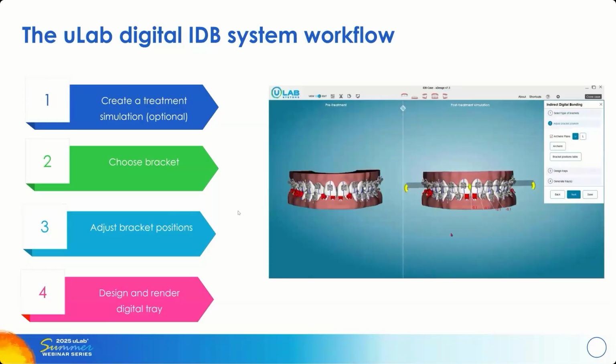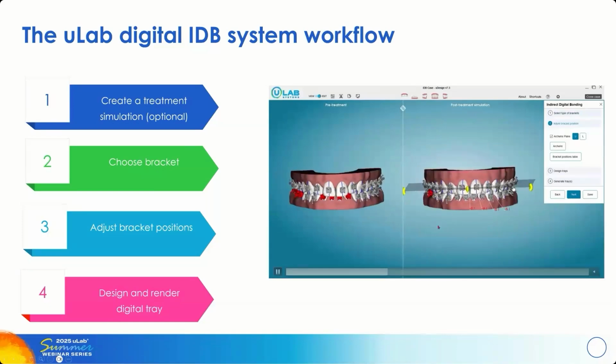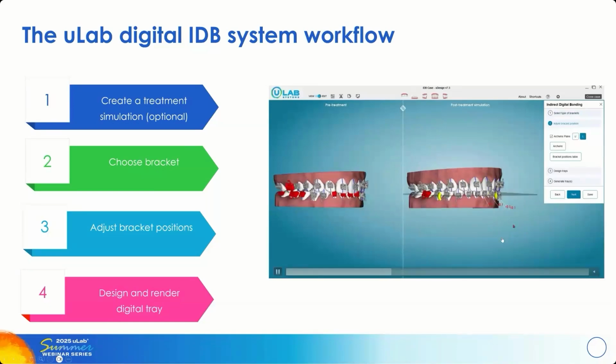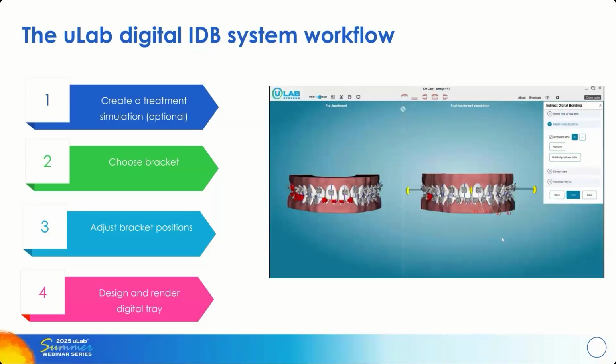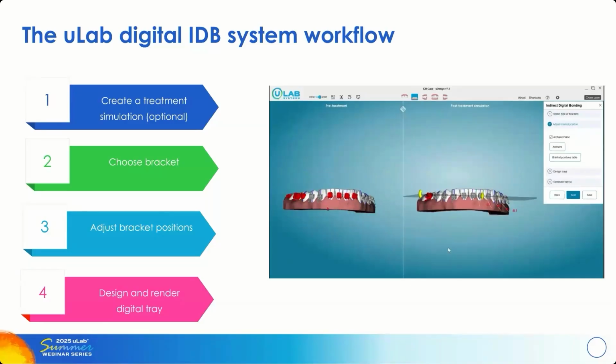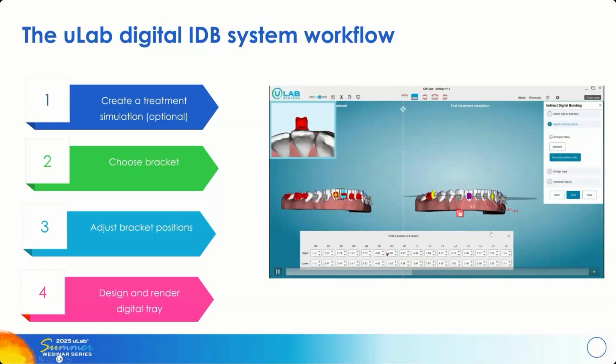So again, this is a big topic, but you can do it today in practice in the uLab system. But you need to know that this is a work in progress, right? And if you have any questions, I'm more than happy to get on a call and talk to you about this. But basically, you can align your teeth, you can define the plane where you want to have the bracket.